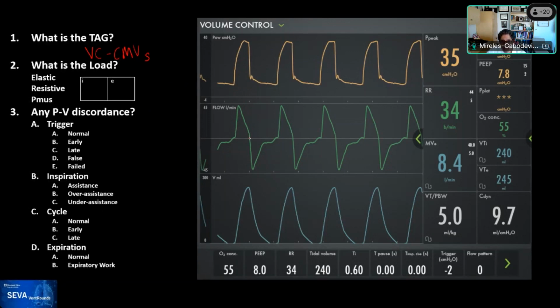And so if you look at this, there's a very big step up, no doubt. But then it dissipates, and actually it ends up very rapidly in a flat essentially part. So I would say, unless Roberto, you have a different opinion, that this is elastic.